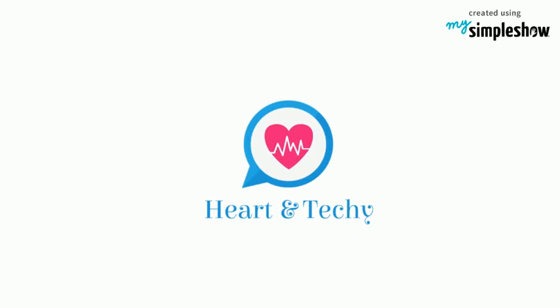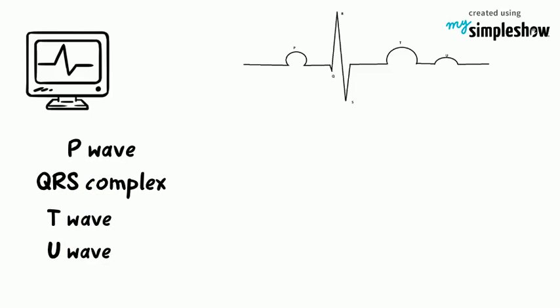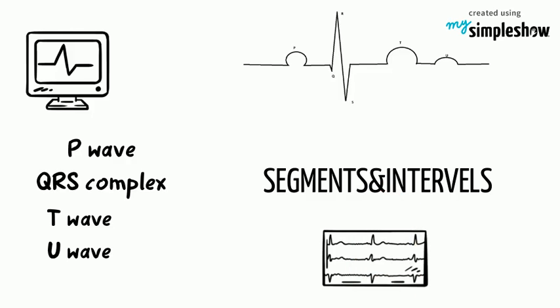Normal electrocardiogram. The electrocardiogram consists of the waveforms P-wave, QRS, T-wave and U-wave. Each wave has its duration and amplitude based upon the waveforms. There are various segments and intervals present in the ECG. Any changes from the normal amplitude, wavelength or waveform morphology are considered abnormal during interpretation.